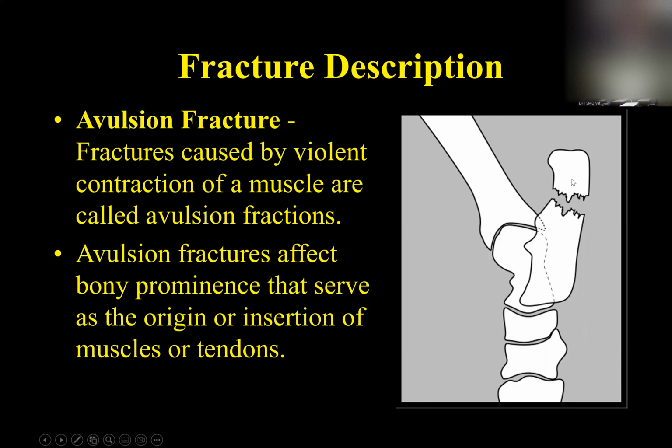When a tendon pulls part of a bone off near its attachment, that has a special name. That's called an avulsion fracture. So that part of the bone has been avulsed from the remainder of the bone. You will only see an avulsion fracture at the attachment site of a tendon on a piece of bone, where it actually yanks off part of the bone itself.